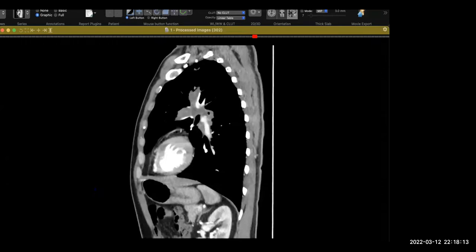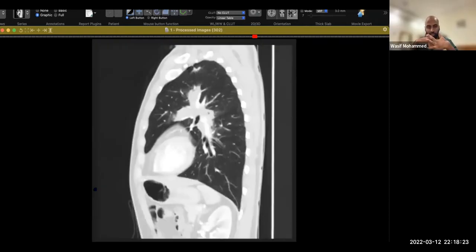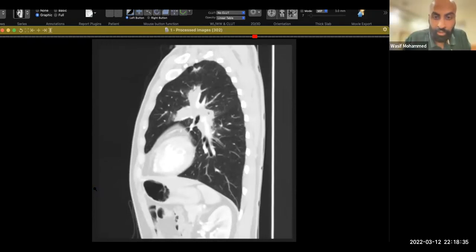So I'm thinking that this could be a lymph nodal mass, which is proliferating along the vessels. What about the shape of this particular mass? Does the shape remind you of anything? It's a flame shape. So this helps me come to a diagnosis of Kaposi sarcoma in this case. Excellent. Yes. Well done.